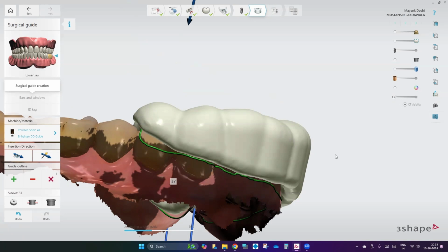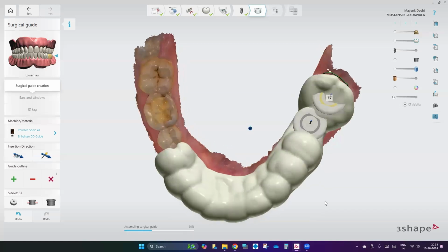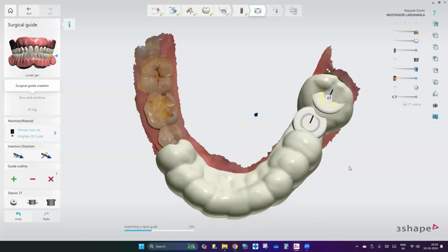So you have to keep your eyes open. There are no fixed rules for anything. There are only whys that you have to answer. I hope this part is very, very clear to everyone. Yes, got it, sir. Okay, once done, I don't need a glue channel for this case.